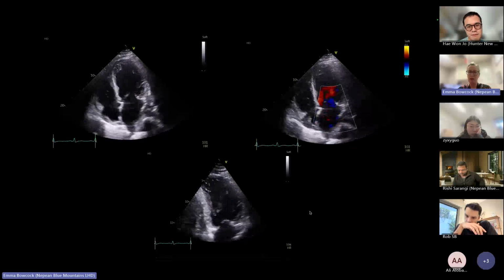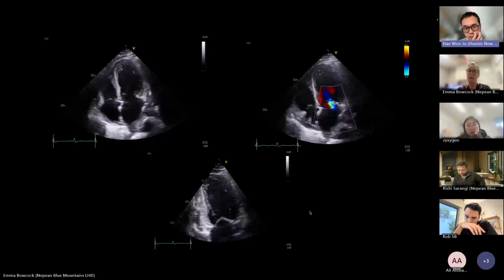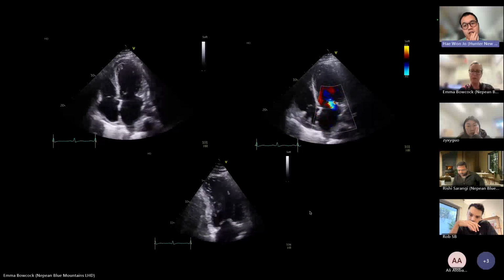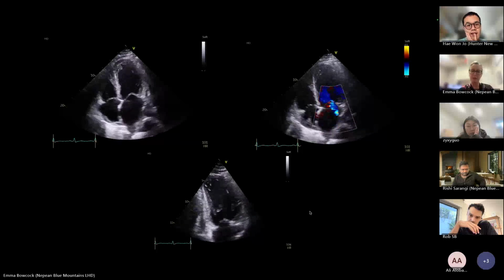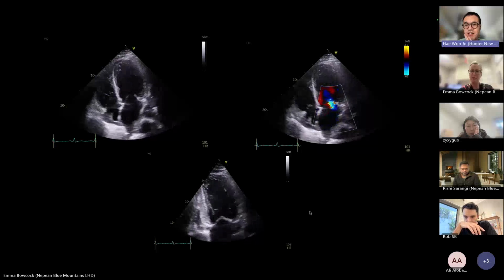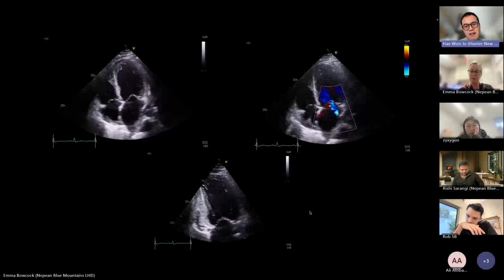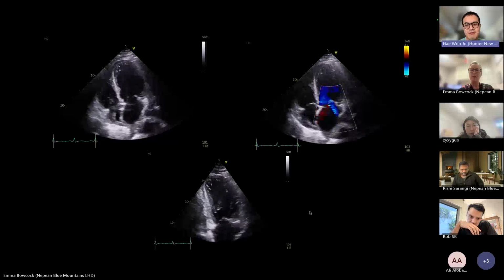Can you comment on the mitral regurgitation? Yeah, sure. So it's posteriorly directed. Gosh, I mean, it's eccentric. The color Doppler doesn't look all that significant, but the LV function is quite impaired. Again, I think in terms of the mechanism, it could be from dilation, as I initially said. It could be due to restricted movement of the posterior leaflet, but I don't think that's the case looking at the 2D image. So yeah, I think most likely it's functional, due to dilation.